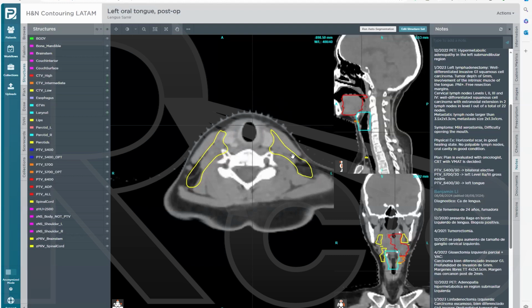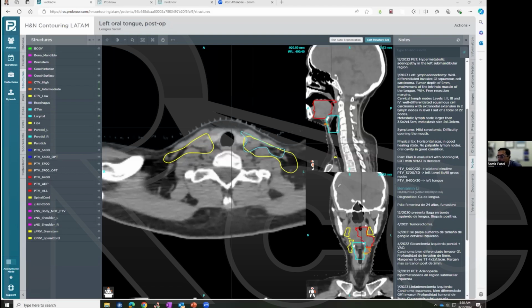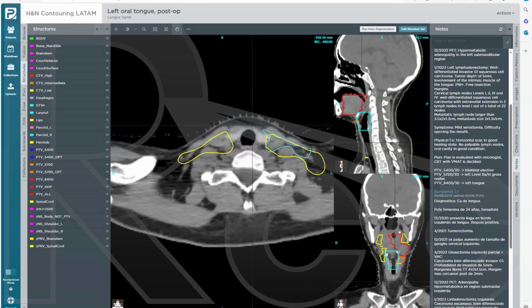Now let's go into this case for level 4. Again, we want to avoid the thyroid gland. Now, we don't need to draw the muscle here, right? So like if I was to draw here, level 4A, anterior border here, this would be level 4A, right? And this will be 5. I think next week you'll have 5. I think my colleague, Dr. McGee, will be talking about 5, but I won't talk about 5 right now, but this is level 4A, okay? Just to kind of give you a sense.